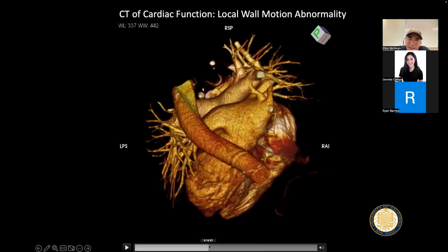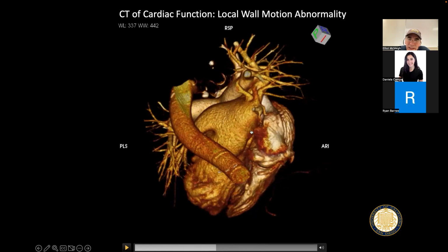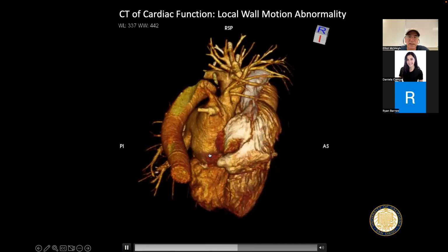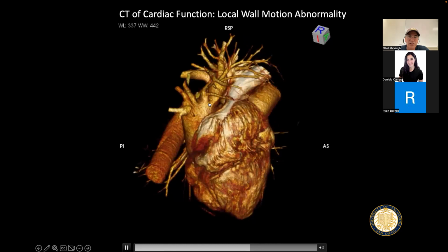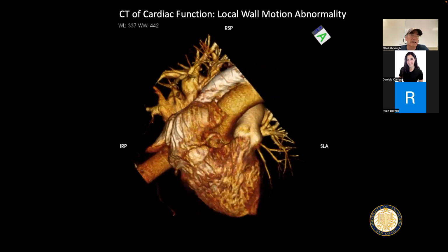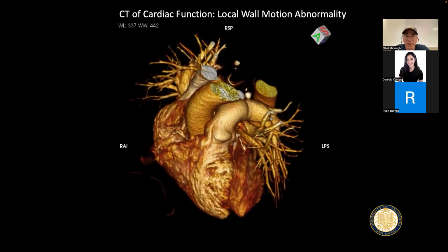And here, if we go to this view, you can see the wall, which is here in between. This would be the anterior wall of the atrium, right? The posterior wall's back here. This is the anterior wall between the two and behind there. And you can see there's a lot of activity in terms of the motion of that during contraction. So there's tons of this data available, and nobody's really taken it and modeled atrial function at the resolution that's available with this data, right?